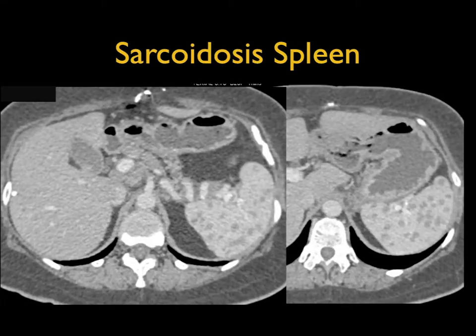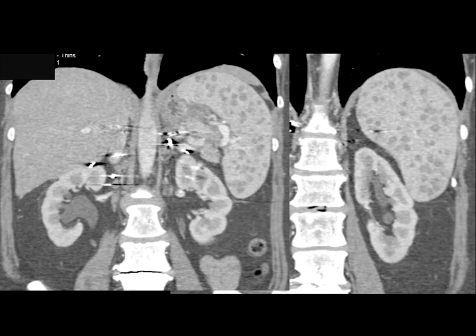In most of the cases, sarcoid is not known when we suggest a diagnosis. Again, differential. Look at the patient's spleen in this case, multiple low-density lesions, classic for sarcoidosis, though maybe not specific. Here the spleen is enlarged, and you can see the multiple lesions. If the patient had a normal spleen and was immunosuppressed and now presented, you could consider abscesses, but otherwise that would be unlikely, and I would be thinking about what this was with sarcoidosis.